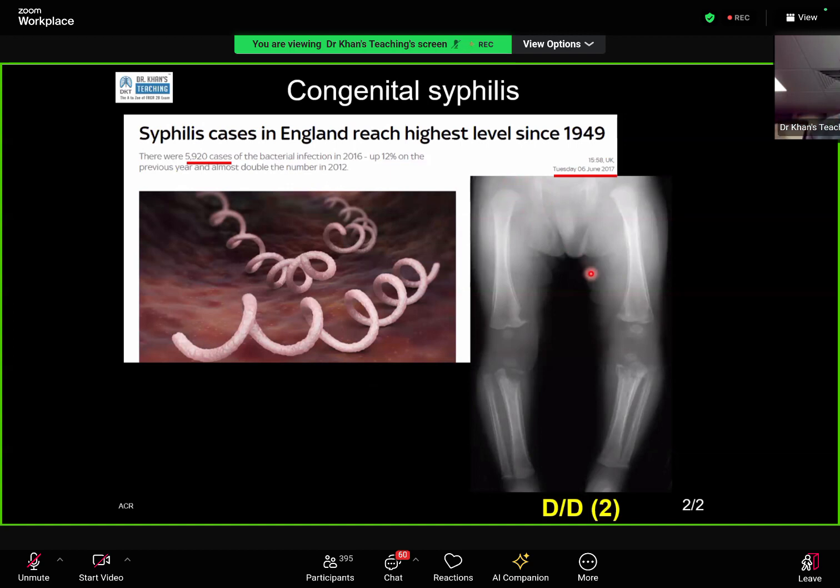Now, you did very well regarding the age of the patient. Age of the patient is judged by the head of the epiphysis of the head of the femora. So the head of the femora in girls can appear anywhere between 3 to 6 months. In males, 4 to 7 months. And we don't see that. You are absolutely right, so the age is definitely less than 7 months. Scurvy, by the way, can happen after 6 months, because till 6 months, the ascorbic acid goes from the maternal blood to the fetus, or the baby, should I say?